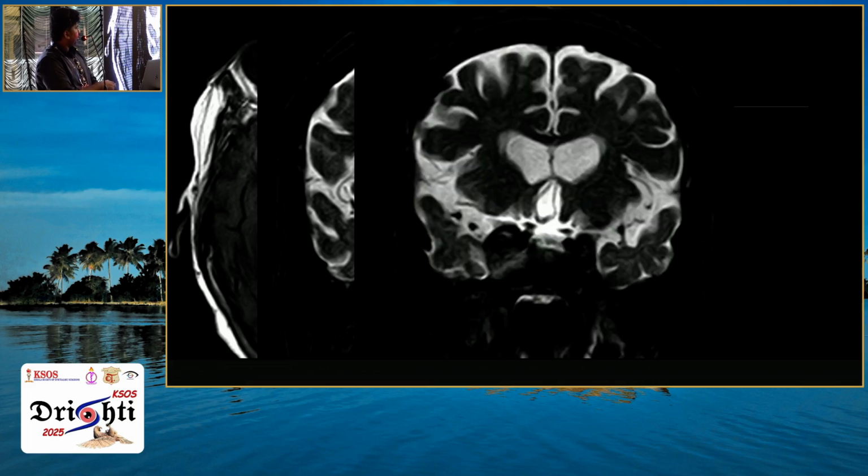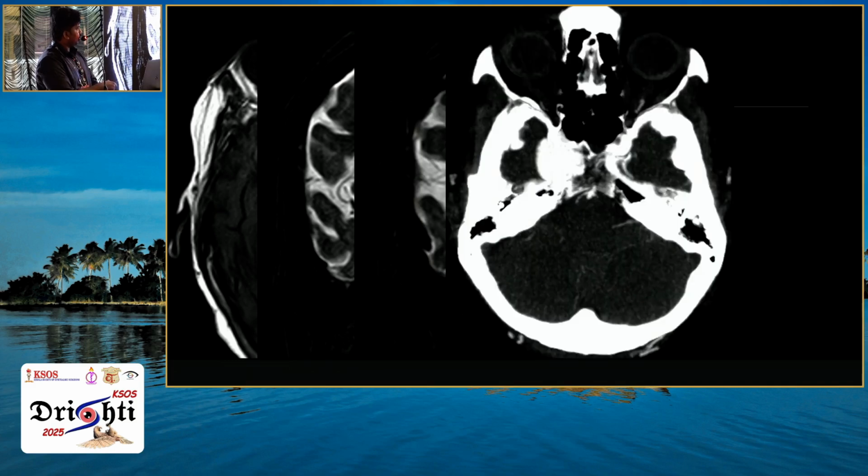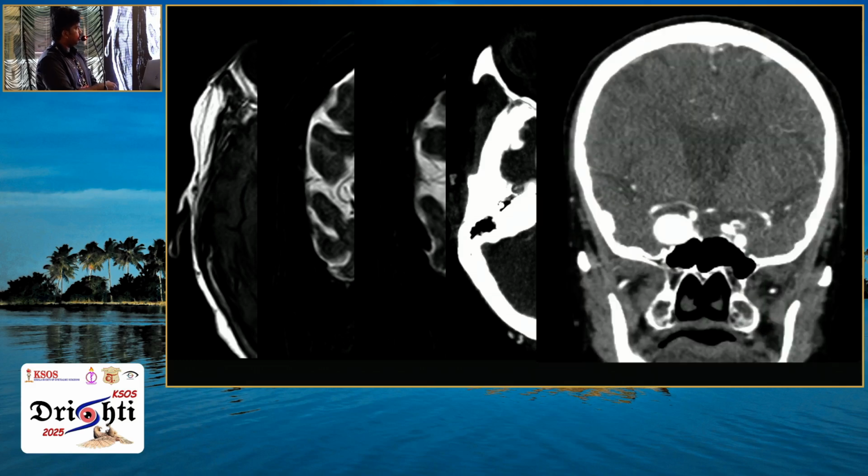If we do a CT angiography for this case, it appears as a ballooned out, brightly enhancing lesion on the arterial phase, which is positionally symmetrical to the opposite side internal carotid artery. This is a case of internal carotid artery aneurysm seen on CT, which you can see better on coronal images.